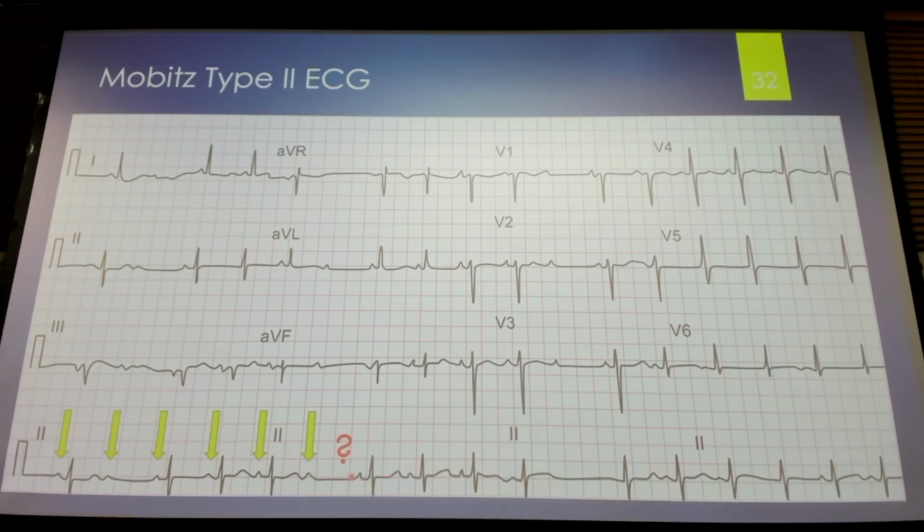So I know sometimes you might think, well, how would I know if that's a U wave or not? We've got to figure that out, right? That's what we call clinical presentation. How is this patient presenting? Maybe we got to get labs on them, okay? But if we have U waves, it's not going to be every now and then. U waves are going to be there and be consistent, okay? Between every T and P is a U wave. They're not going to just come every now and then, because the mechanism of that is usually electrolyte derangements, and electrolyte derangement is not changing every beat of the heart.